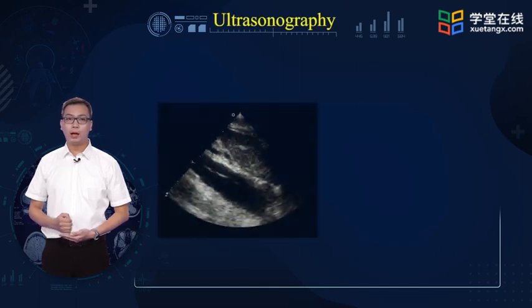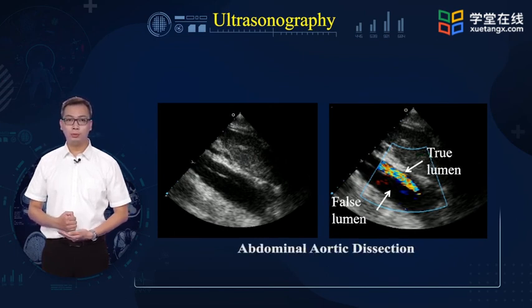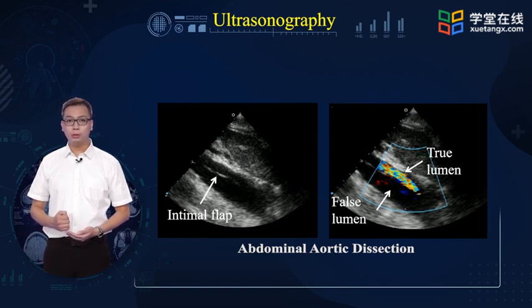The advantages of ultrasonography are relatively low cost, availability, and non-invasive nature. An ultrasound can display the true lumen and false lumen of an aortic dissection separated by a light linear intimal flap. The color flow during ventricular systole suggests that the upper lumen is the true lumen. However, bone and air in the chest limit the use of ultrasound to assess thoracic aortic dissection. It also cannot reliably identify the proximal and distal extent of the dissection.